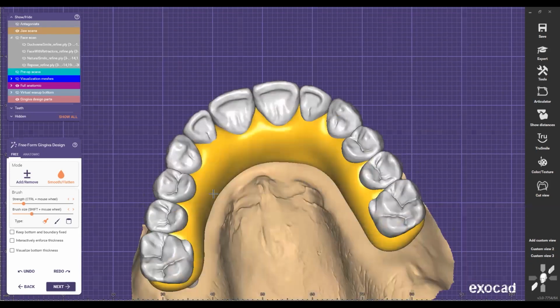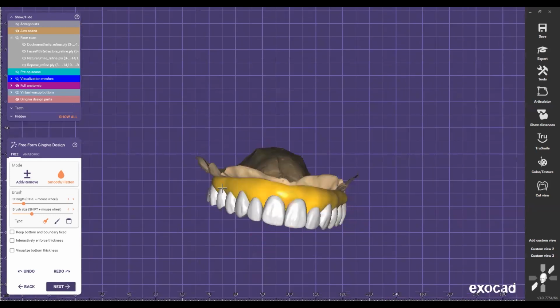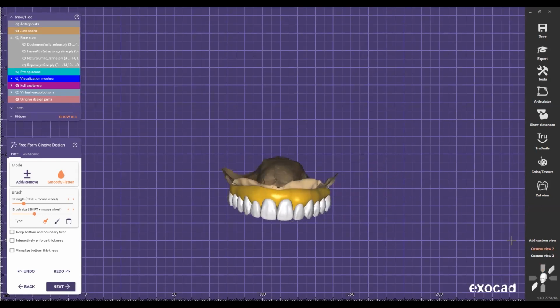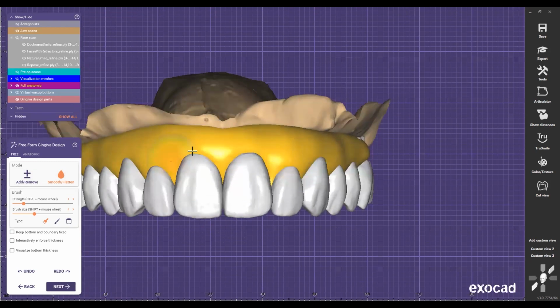But first, I try to make a nice shape, right? And I need to communicate this with the doctor so they know how much bone reduction I'm expecting to cut. Usually we have the CBCT here as well, so we can see if we're gonna have enough bone there. In the CBCT, I have the STL and I can say, okay, you know what, I can go up to there, because sometimes we don't want to cut too much, right? We want to preserve bone as much as possible, and having the CBCT here aligned just gives us extra information there, okay?